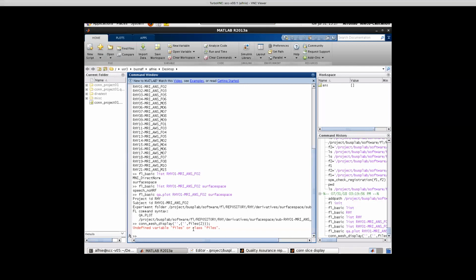And it's the same as for the volume case. When we want to look at the individual subject data at the first level, we want to look at it not on the MNI volume, but in that subject's volume. In this case, it's the same thing. And FreeSurfer does a pretty good job, a better job of co-registering the anatomy, like normalizing the anatomy of this individual to the FS average surface, but it's certainly not perfect.